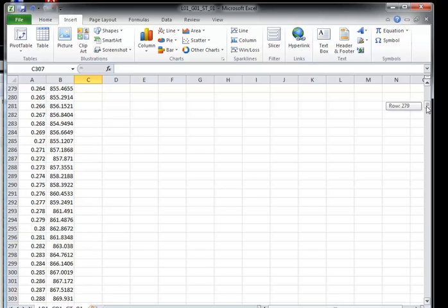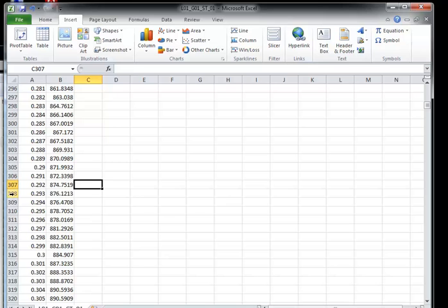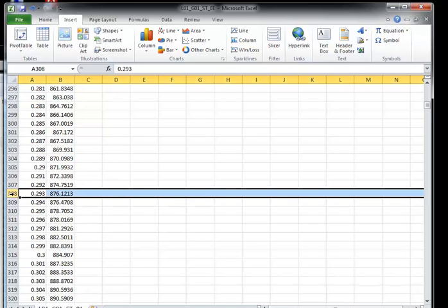Going down a little bit more, I've gone past it there. Okay, there we go, brilliant. So it's gone above 876 newtons. So we can consider that to be the starting point. So we've got a time of 0.293 seconds and a force value of 876 newtons.